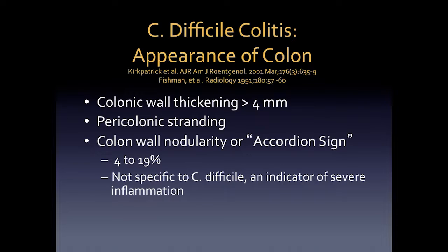What it indicates is severe inflammation. So we see it in the severe cases of C. difficile colitis, but you can also see it in severe inflammation of the colon due to other infectious agents or even things like Crohn's disease and so on. So it is not specific to C. diff. That said, because C. diff is so common, oftentimes when we see it, it does turn out to be C. diff.